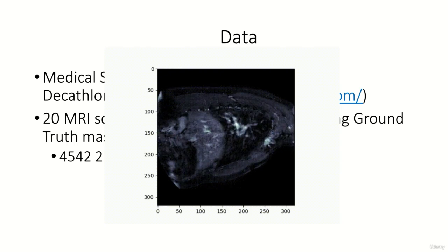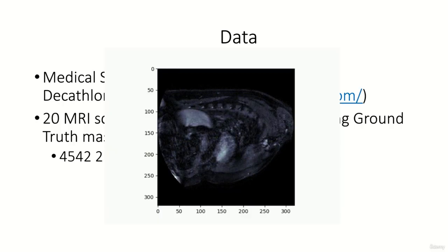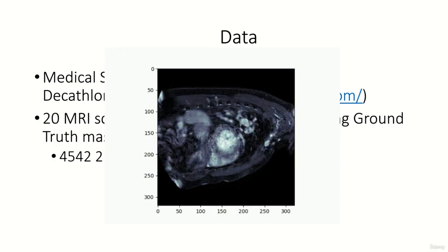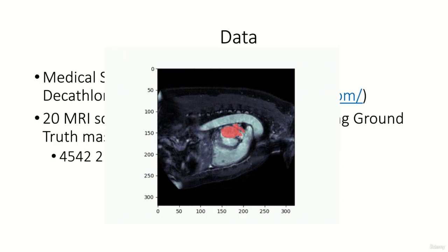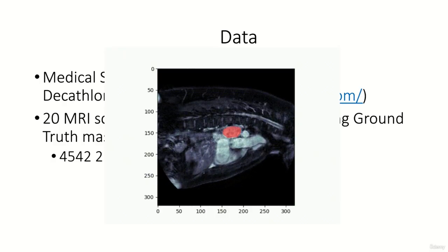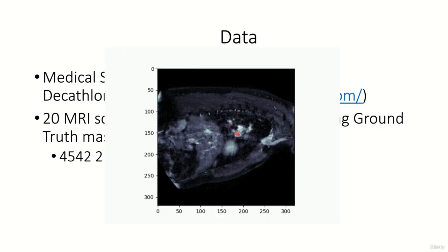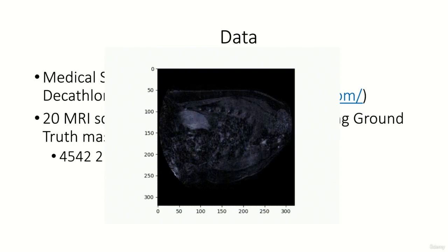It's the RAS orientation of the scan. As the y-axis in the sagittal orientation moves from posterior to anterior or from back to front, the top rows of the image visualize the back of the patient. In contrast, the x-axis slices from inferior to superior or from bottom to top. Therefore, the left columns visualize the stomach and the right one the neck.